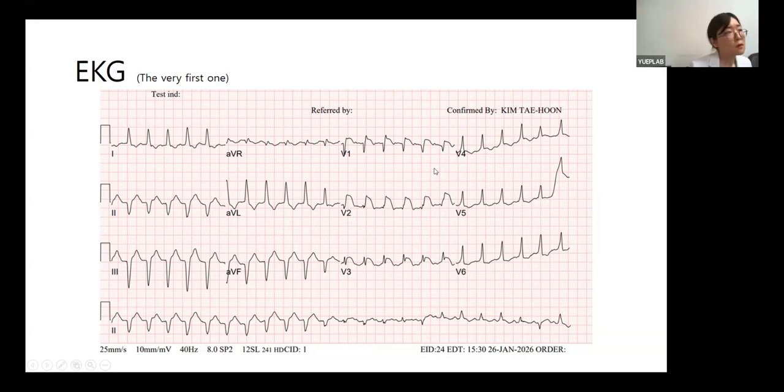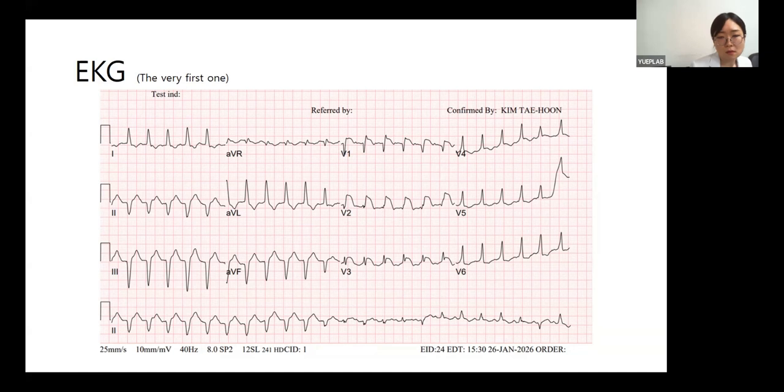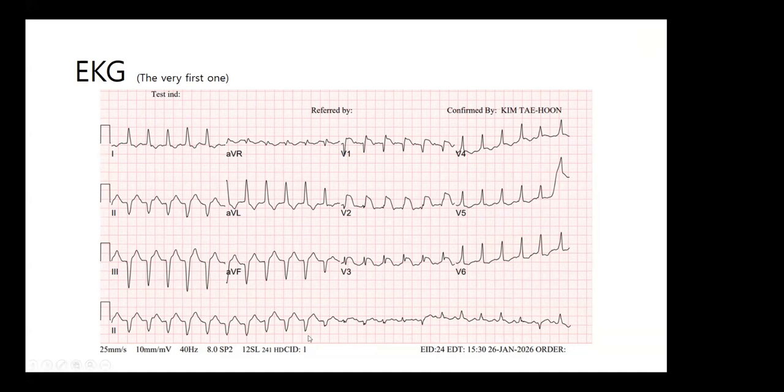Okay. Still, I am curious why the later part has a narrow QRS rhythm change after a single PVC. Is it related to the underlying bundle branch block? No. I think if you look, when the wide complex terminates, there is a gradual different degree of fusion going back and forth between sinus and the VT. Usually all those are fusion beats. Yeah, they're all fusion beats. And you only become normal sinus rhythm at the last, let's say 5 beats from 7, 8, 9, 10 become normal beats. Those are all fusion, because the PR interval changes slightly. And then the very last second one is also fusion.